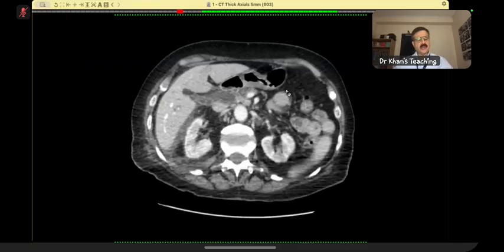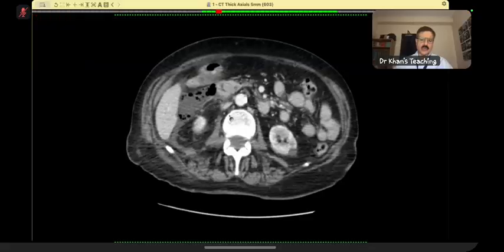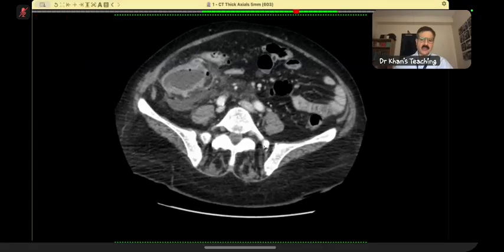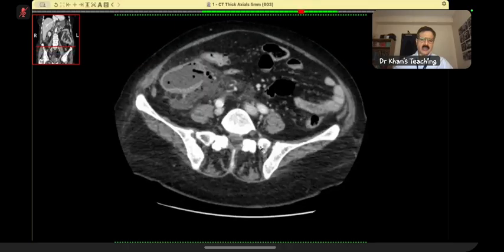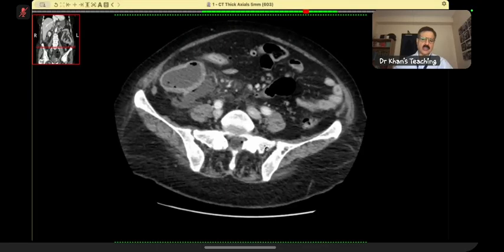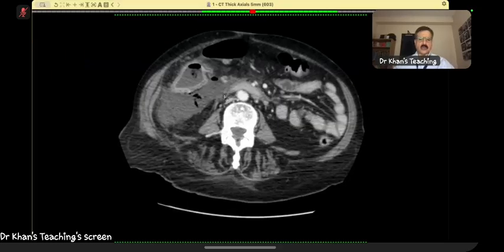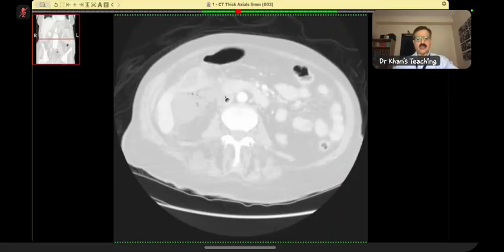Now, first of all, candidate 4, you should have asked for a lung window for the air, isn't it? In any case, I think you just saw it and you did not ask for it. Now the interesting bit is that first of all, there is extraluminal air. Extraluminal air means your area of interest is around the cecum and the ascending colon. There are air bubbles. Of course, you can ask for a lung window or a bone window, whatever you want, to see extraluminal air.